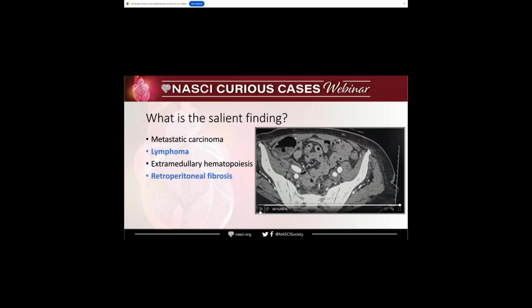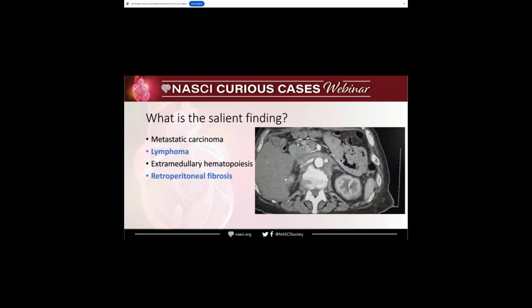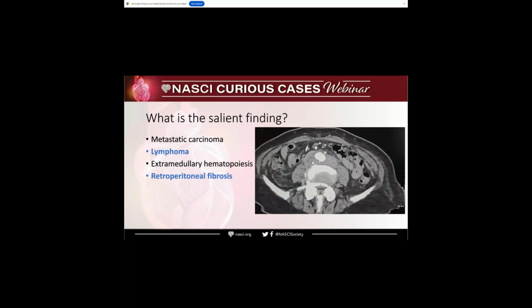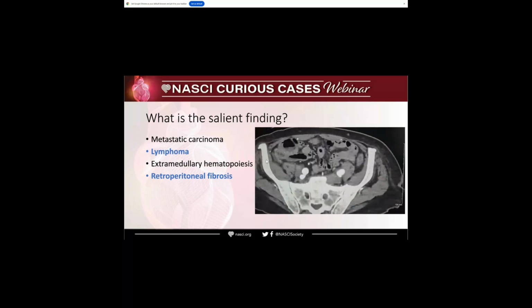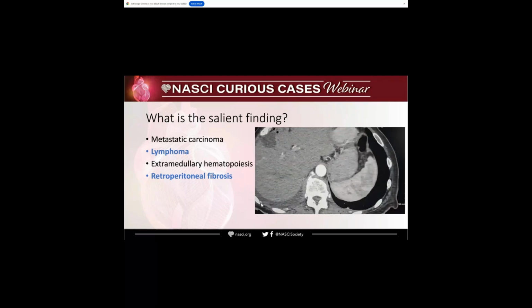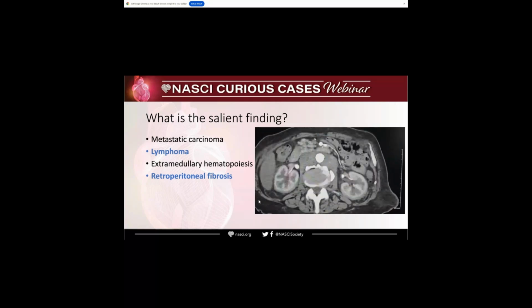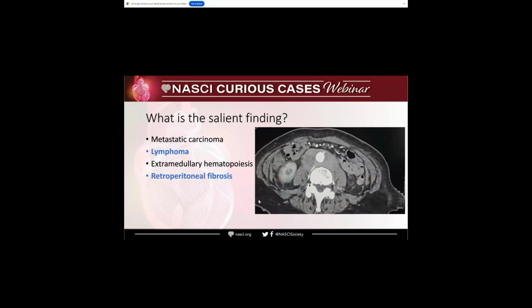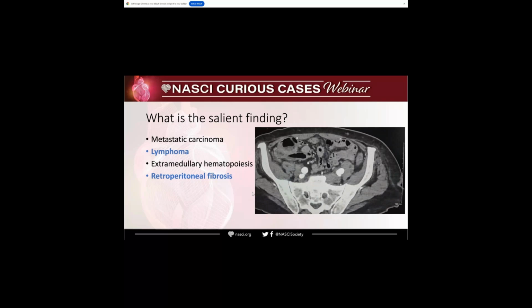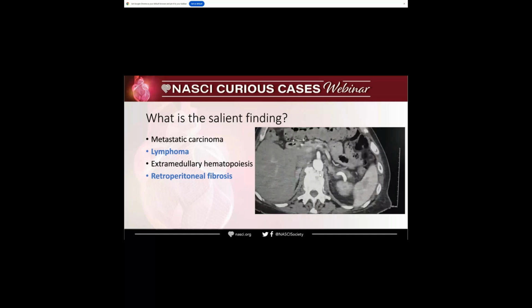The other thing is, if you look at the texture of the finding, I'm ready to bet that probably the IVC is somewhere here. And because it's essentially an arterial phase, it doesn't enhance yet. So I think we're talking about something that is fairly homogeneous. It does not enhance substantially, but we don't have the pre-contrast phase here. I would favor lymphoma. And if you look again, it also displaces the aorta forward.